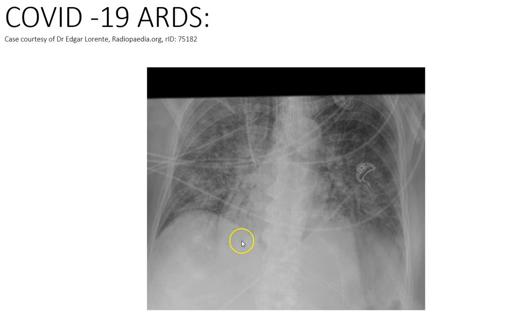The hemidiaphragm here looks, I mean, I can't count the ribs down, but potentially that's quite raised just from the shape of it. But that could just be the angle at which the film has been shot. But the takeaway point here is this: there's this inflammatory exudate that fills the interstitium between the cells in the lungs, and just floods throughout the whole of the lungs. And so anything like that is something that physiotherapy can't necessarily treat in and of itself, that interstitial process.